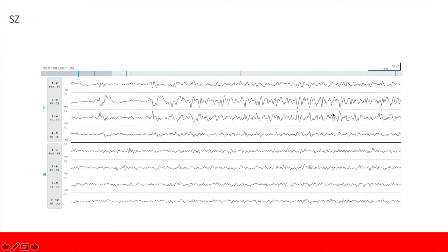It can also be evolving if this seizure activity propagates to the neighboring channels. So it could be evolving in time, meaning the frequency is becoming faster, or it's evolving in space because it propagates to nearby cortical regions or the ones connected with the source of the seizure.